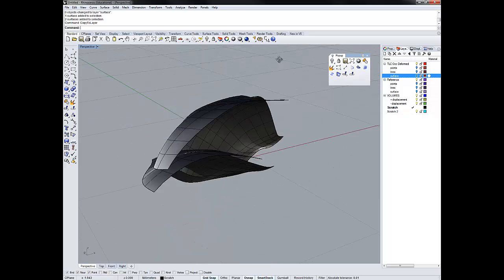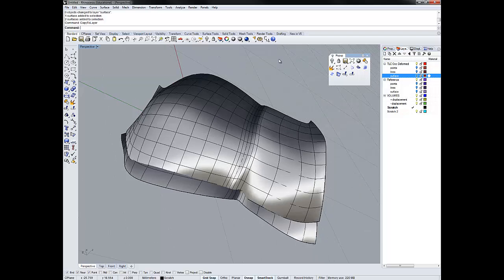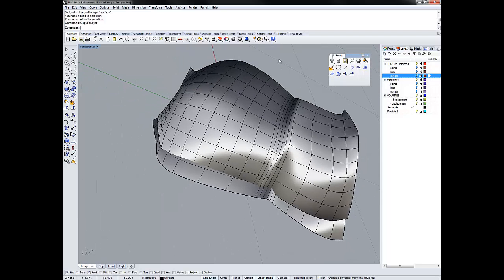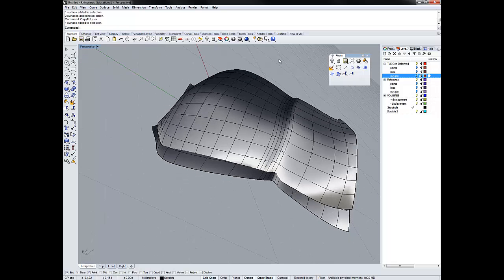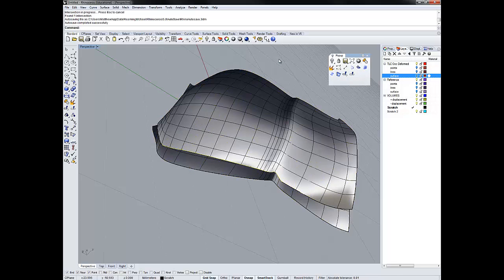Okay, so we need to figure out a way to define the volumes that we will use, and that is the intersection between these two surfaces. So we have several ways to do that. One of those ways is with an object intersection. The other of those ways is by doing a Boolean. We're going to do the object intersection. So what I'm going to do is select both of these surfaces. For the second one, I hold down Shift, and then I'm going to click object intersection. And so it's going to say it found one intersection, and that intersection here is shown along this path.